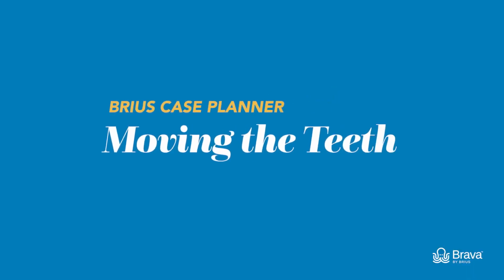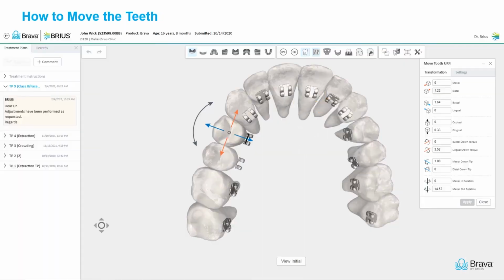Now we will discuss how to move a tooth. To move a tooth, you just simply click on the tooth. When you click on a tooth, arrows appear. When you click on each arrow, the tooth will move in that direction. Notice the curved arrow. When you click on this arrow, you rotate the tooth.